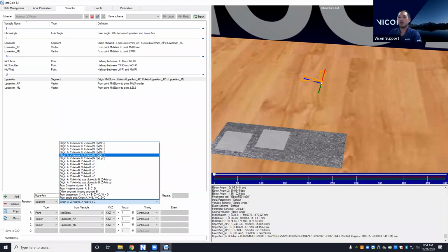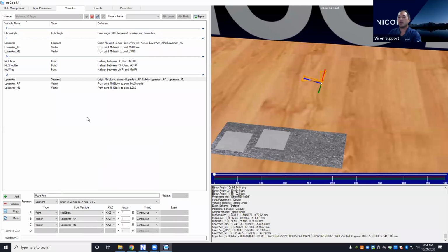As you can see that my points or my vectors need to originate at the same point as the origin, which doesn't necessarily give you the vectors that you would want to cross necessarily. And this is where having some of those biomechanical principles would help because it would help you choose the correct vectors that you wanted to use. So you can see here very easily, I can change the orientation of my segments very easily.